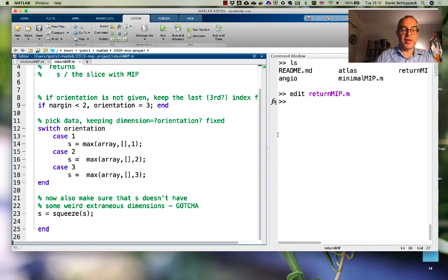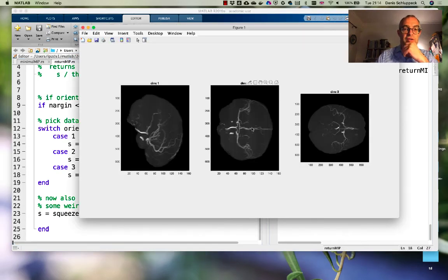Okay, so I'm going to stop this recording here because this seems quite a nice chunk. Before I let you go, just think about some of the things that you might want to double check here. So is the color map maybe the best to look at? How could we change the contrast in this image in the sense of maybe giving us slightly better differentiation between the brightest and the darkest bits in the image? How could we highlight things here? How can we add some text information to help us get oriented in this display a little bit better? Various other kinds of ideas of how you might want to play around with this.